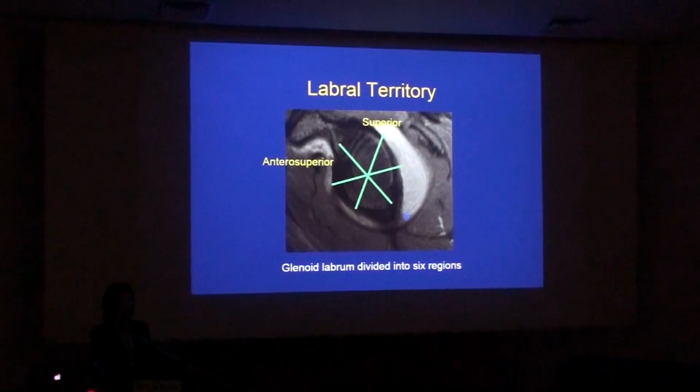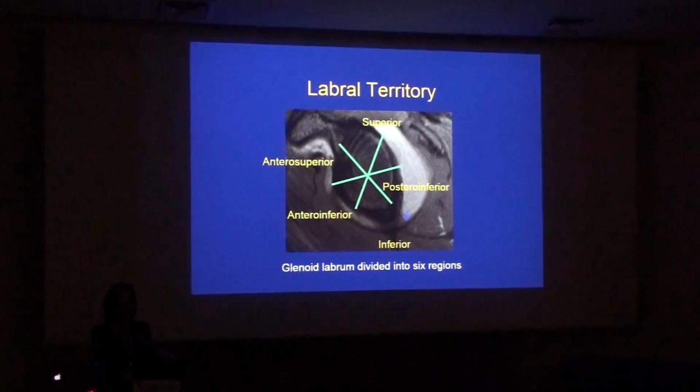And so this is the front. We have the middle right there, the equator, and below the equator, the antero-inferior portion, where a lot of the anterior dislocation instability is formed, and we have our labral lesions here. Less commonly, they go inferiorly, and then postero-inferior and postero-superior, often with multi-directional instability, posterior instability.